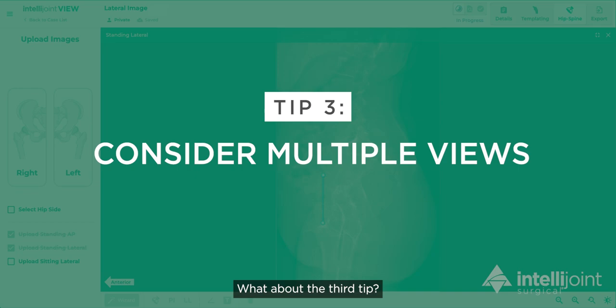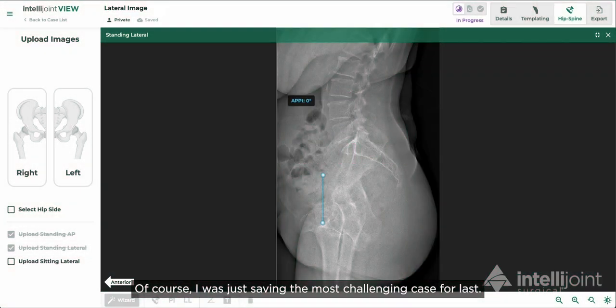What about the third tip? Of course, I was just saving the most challenging case for last. Here's an example of where bowel gas is really obstructing the landmarks we need. Brightness and contrast can't help us when dealing with this type of challenging lateral image.